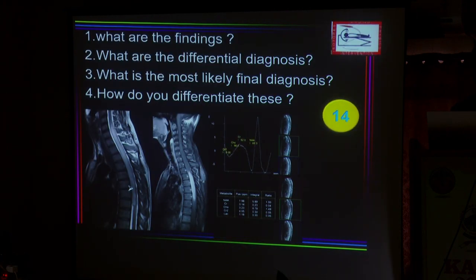So this is the last question. What are the findings seen here? What are the differential diagnoses? What would be the most likely final diagnosis, and how do you differentiate these?